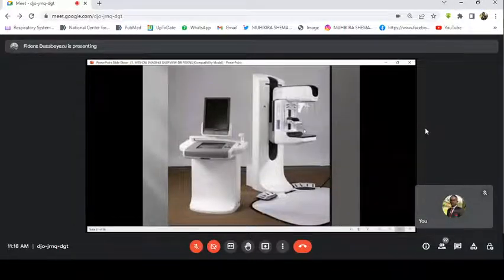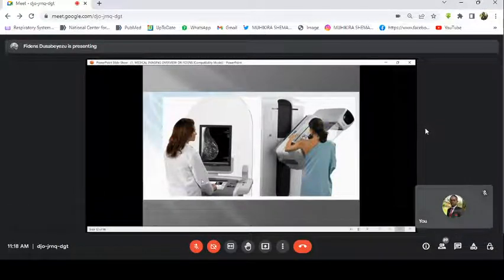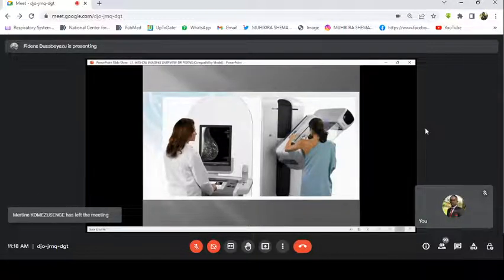For example, in the procedure, can you see it can change the orientation. It can take either craniocaudal, from up down, or lateral oblique, like in this case, this is lateral oblique. And now the operator, can you see how the image has been processed? The dark gray is fat. So meaning this patient is not that young, even if from behind you can tell it is young.